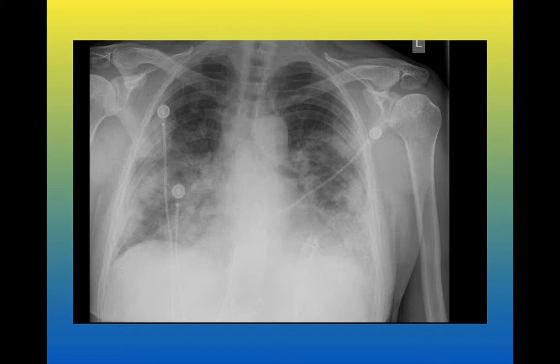Here's the X-ray that we got in the ER. Again, both-sided process, diffuse process. Now you've got to think of your differential for this patient.